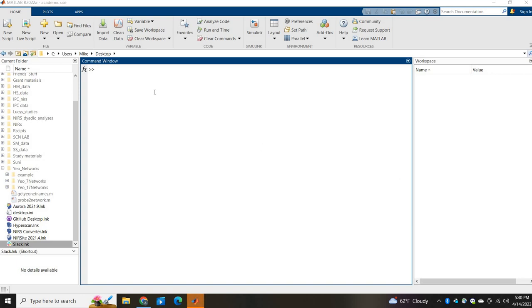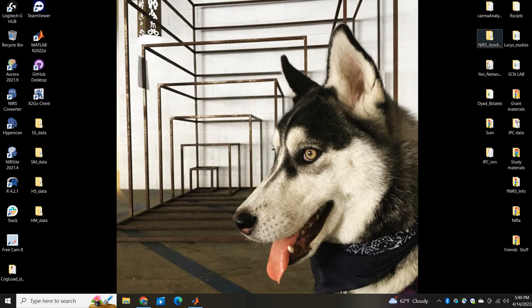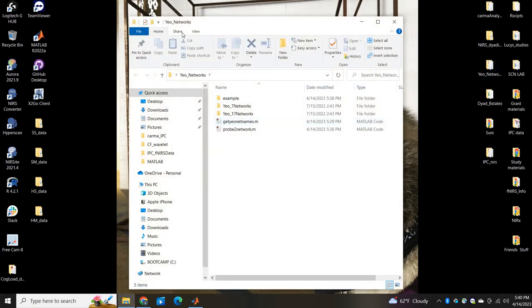Okay, so this is just a very brief video to show you how you can use your channel MNI coordinates from your NIRS probe montage to get the Yeo Networks. So what do you need for this? Well, one, you can get the Yeo Networks folder from my GitHub. It's going to have 3 folders in there as well as 2 scripts.